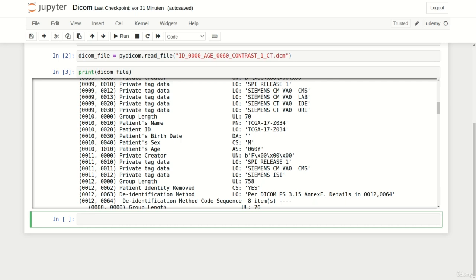As an example, the identifier, which describes the number of rows in an image, is 0028 0010. To access this entry, you need to access your DICOM file and then use those two identifiers as an index. In fact, you need to convert those values to hexadecimal first.